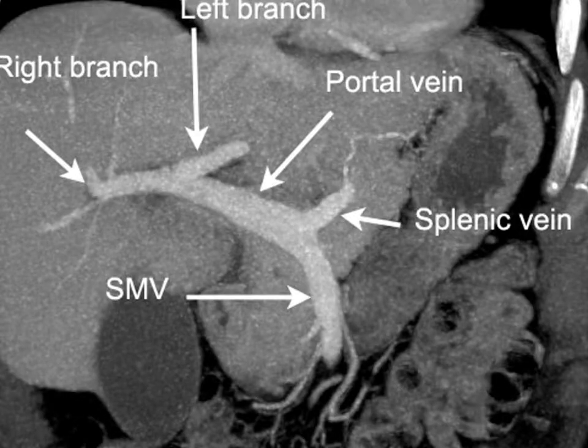First of all, this is an IV contrast that you can see easily with CT, not an MRI. Second, the density pattern is that of a CT scan. Third, you can see the ribs, the bones, that cannot be seen on MRI like that. So obviously it's a CT scan. And the fat is dark, you can see around the liver. Usually it's bright on T1 and T2 images.